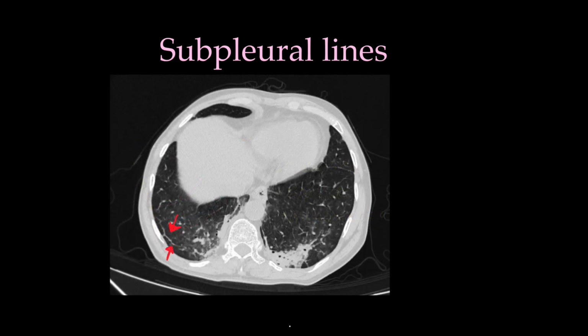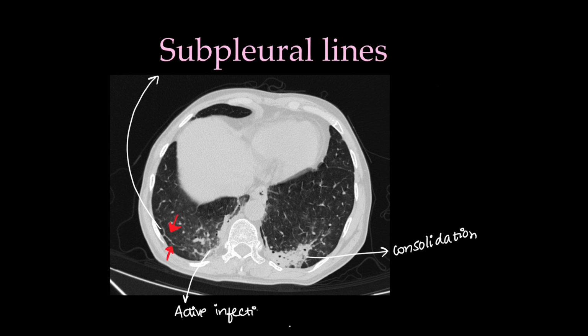See, here we can see the subpleural lines or bands. Other thing which we can see in this image is consolidation. Here we can see some infection.